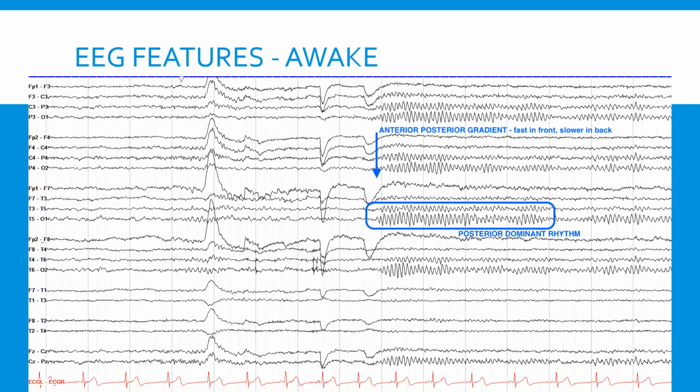Okay. So this slide is very important because this is basically the normal awake EEG. So let's just orient ourselves, because the montage, or how the EEG is set up, is different every time. So again, this is F3, C3, P3. So this is on the left side, and because the numbers are small, these are basically the midline ones, right? So this is left, F4, C4. So this is right. And then this is F7, right?